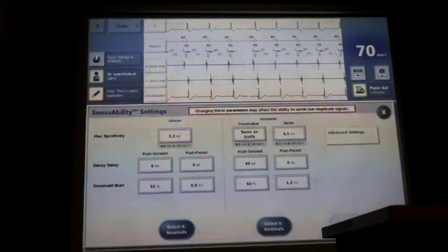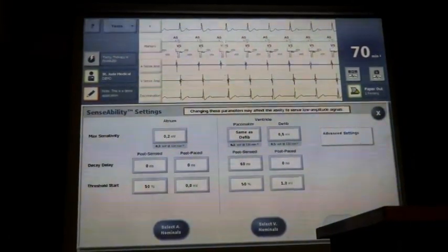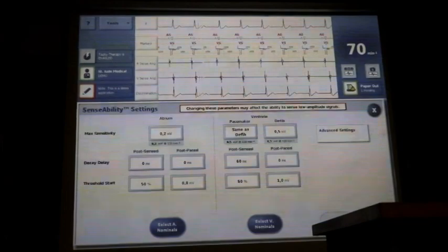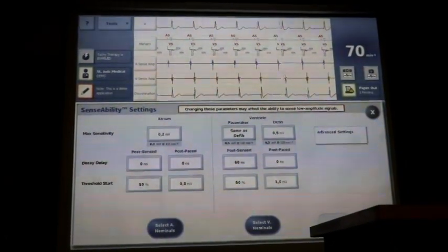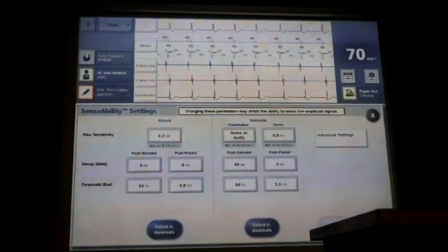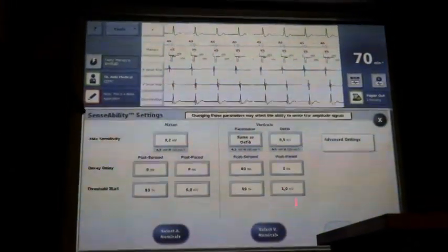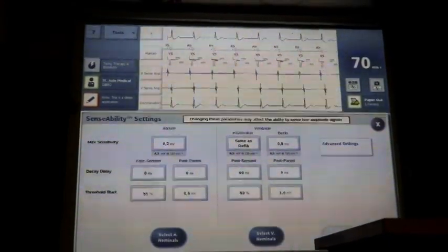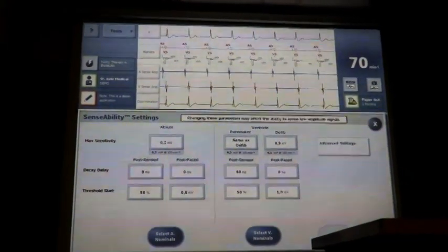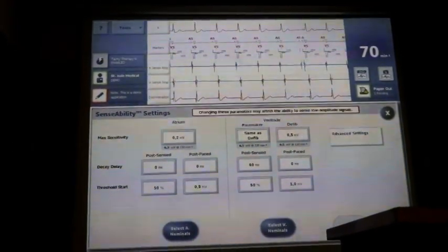What we do sometimes see, I did say earlier, there is no T-wave sensing on Abbott devices when it's sensing. Virtually none with new devices. I haven't seen it. You will see it occasionally when you are ventricularly pacing, but it never results in inappropriate shock. We'll see why in a minute. So if you get some T-wave oversensing post-pace, you want to be changing these settings here, not these. We may ask you to move this up a little bit to 1.2 or something like this. It just depends on the situation. The max sensitivity here is 0.5. But you can imagine if you did this here.